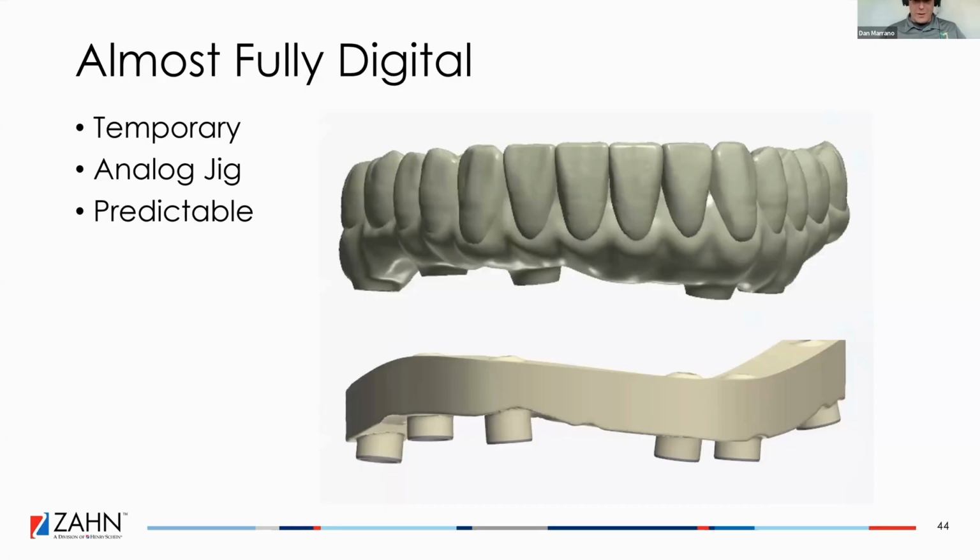And then we just take that jig. Maybe you print two. For a long time, we were printing two prototypes. One we would stain and glaze and make nice, and the other one we would just leave plain. And then they return the jig to you with the second one that maybe they made some occlusal adjustments on, and then you just put it on the patty. You pour the patty up, you pour the jig and patty, and put it on there, and then you just scan copy it, and then you're on your way to your final.